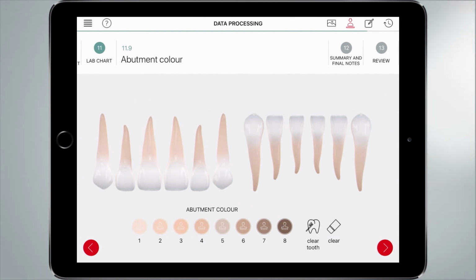in which you have the chance to select the color of the abutment, because we are talking about full ceramic restorations, and the color of the abutment underneath is very important. We have more or less a regular color, but we have more intense color on the two cuspids on the upper, two cuspids on the lower, and we have less colored, or maybe even less than that. You can say 2, 2, 2, and 2 instead of 3. And we have 1, 1, 1, 1, 1, 1, 1, 1. So quite light color on the lower and upper incisors.